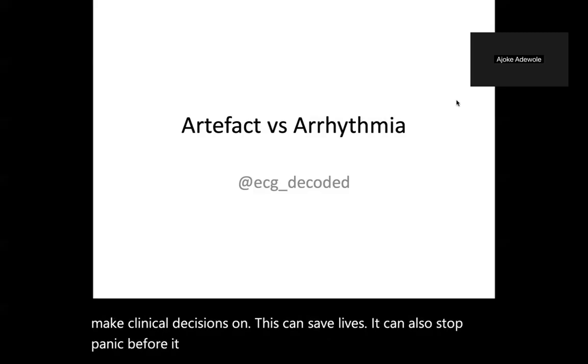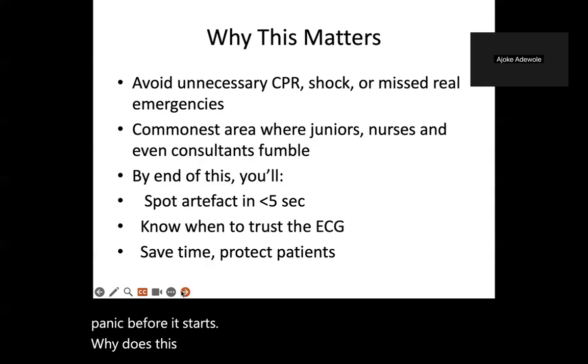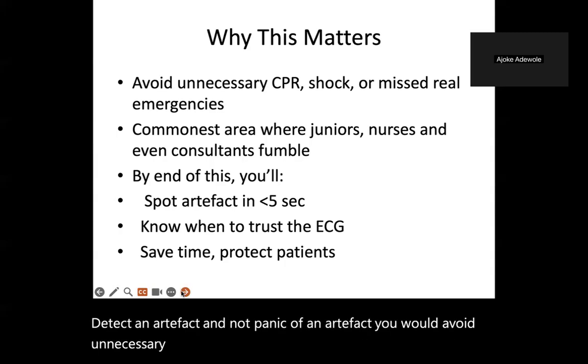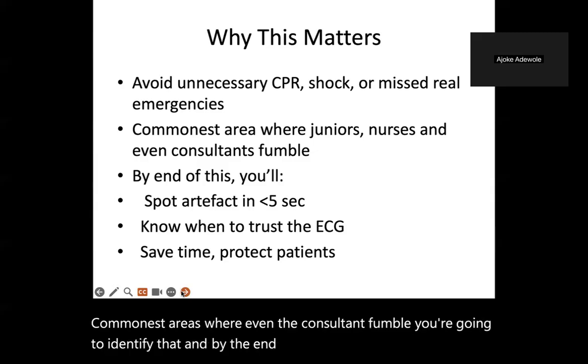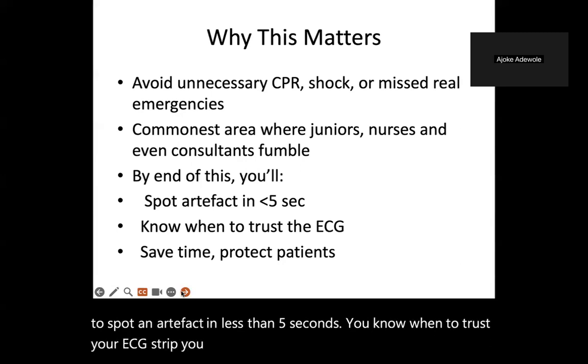Why does this matter? It matters because if you can detect an artifact and not panic over an artifact, you would avoid unnecessary CPR, shocks, or missed real life emergencies. These are common areas where even the consultants fumble, and you're going to identify that. By the end of this presentation, you'll be able to spot an artifact in less than 5 seconds, know when to trust your ECG strip, save time, and protect your patients.